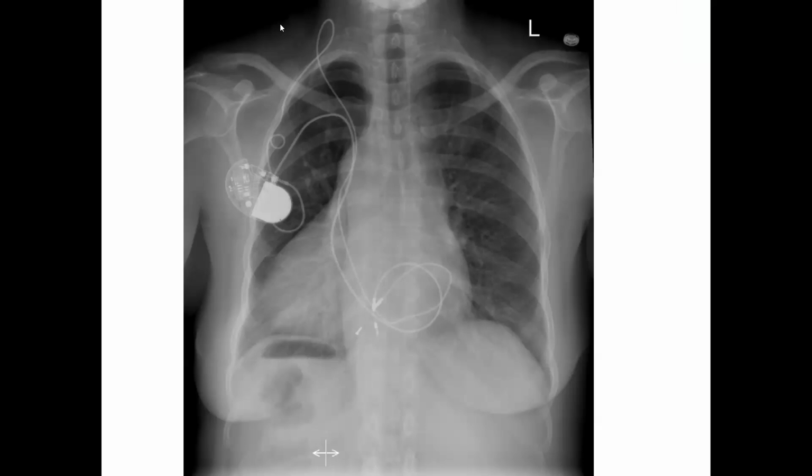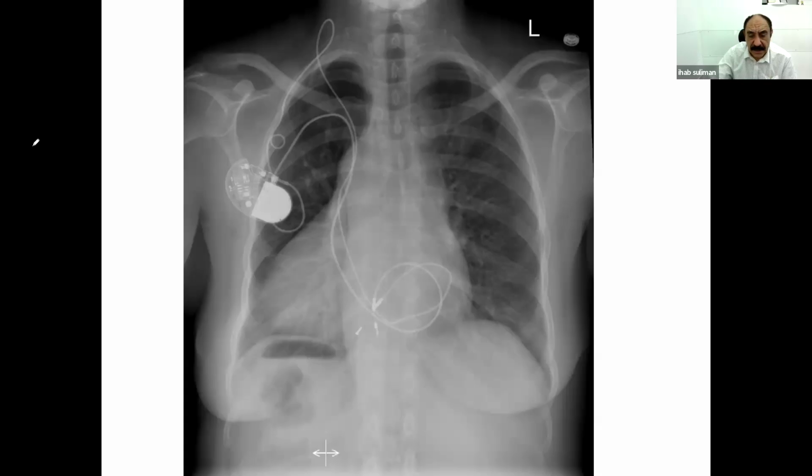When I look at the X-ray of this patient, specifically on the cardiac shadow, it looks like there is a dextrocardia because the apex looks to be... Excellent. So there is dextrocardia. She's a female patient, by the way. So this is a female patient, and you correctly diagnosed dextrocardia.